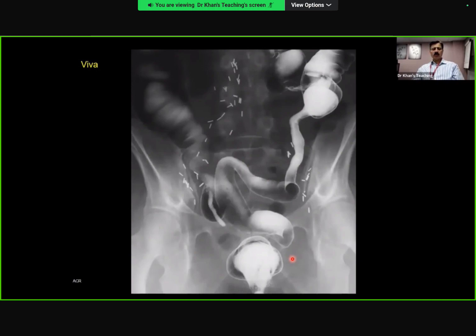But post-radiation change, unfortunately, just goes on and on. And over time, you can have fibrosis also. So there can be long segment strictures. You will see cases in which there can be chronic as well as acute changes. So there can be a bit of overlap. Overall, in the exam, they will always show you post-radiation where there will be some stigmata of old surgery, like this or some other on a CT scan.